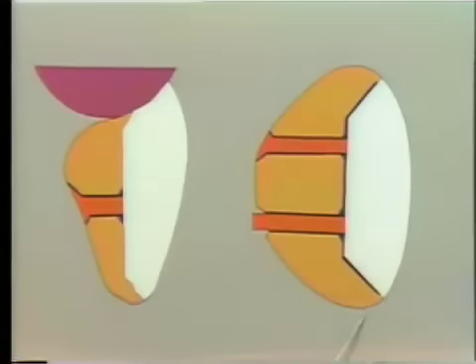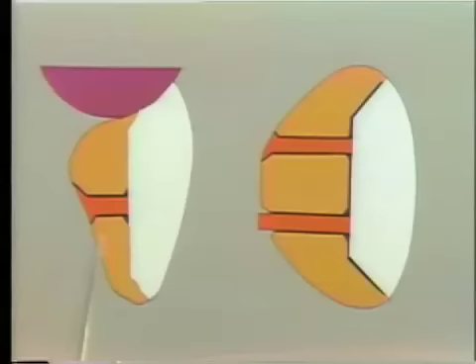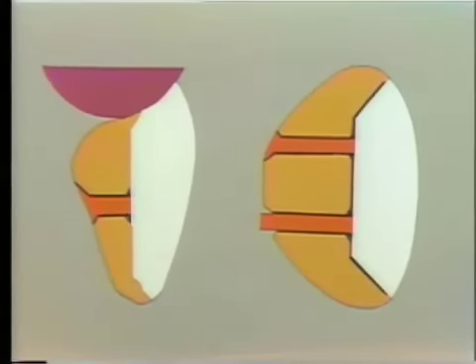If it is too far this way, the solder from the contact point may run in there and prevent the facing from seating satisfactorily in position. So a recognition of this relationship between the porcelain and the gold, both in this direction and in cross-section this way, is important in understanding the construction and design of this type of long pin facing.